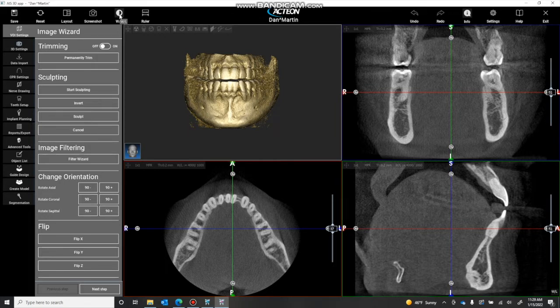This is contrast. You'll notice right now I have an arrow for my mouse pointer. If I left click, now I have this round ball. If I left click and hold and move my mouse physically forward or backwards, I can add or remove some of the contrast here. So I can kind of help the scatter.